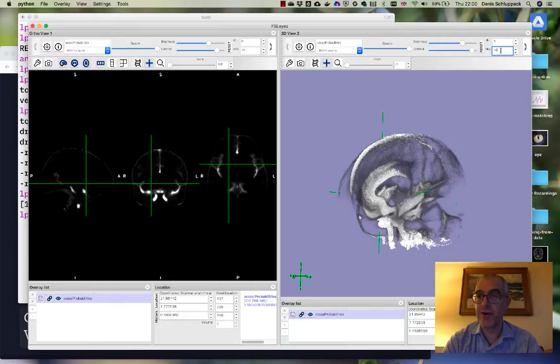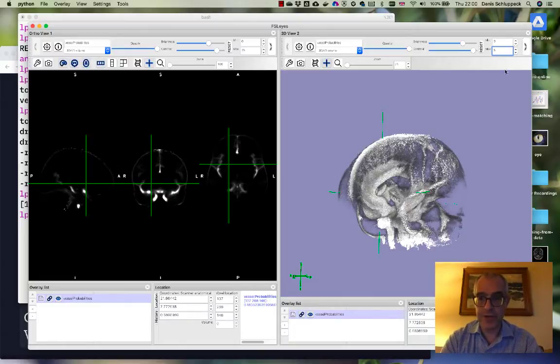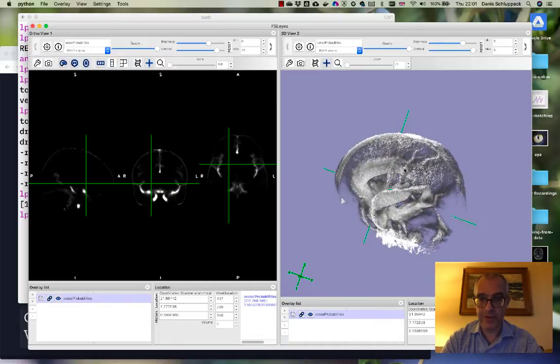Because as you are changing that number to a lower value, say 5 in 100, you're becoming actually less stringent, right? So it's sort of nearly like a confidence interval in space about where you think these things should be, okay? So if I change this to 5, right, then I'm being very loose about what I'm willing to accept.